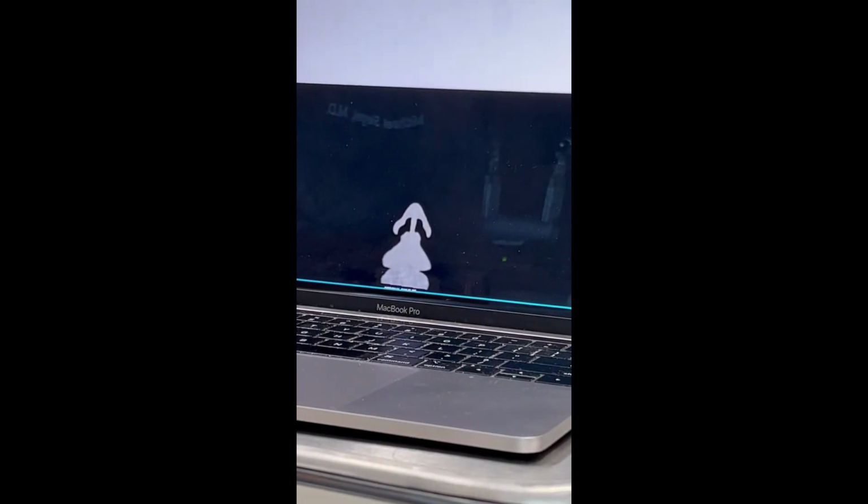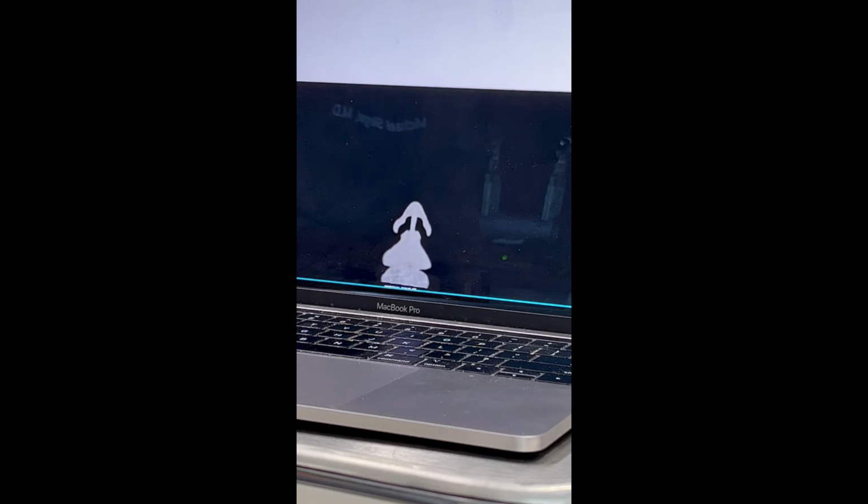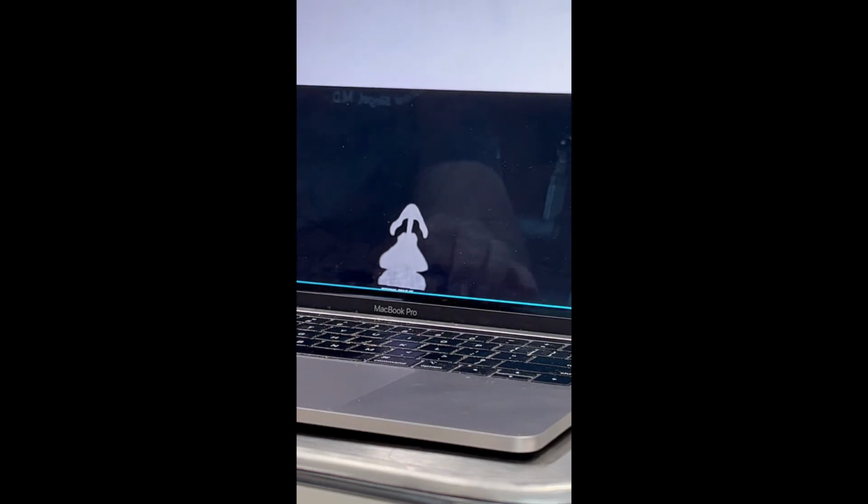Okay, so what we have here is a CAT scan of the sinuses, and I'm making this video so that you have some idea of what we were talking about when we reviewed the CT scan with you. So what we're looking at is a CAT scan here. Make it easy for you to orient.